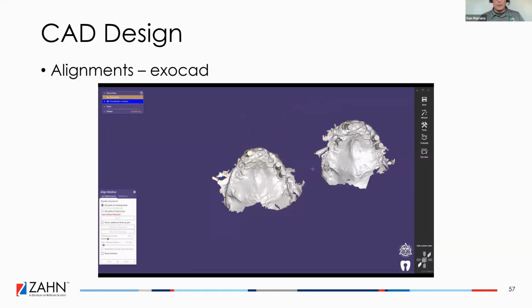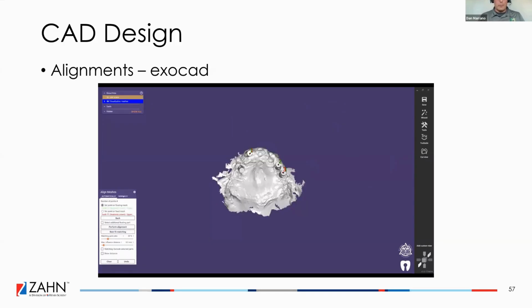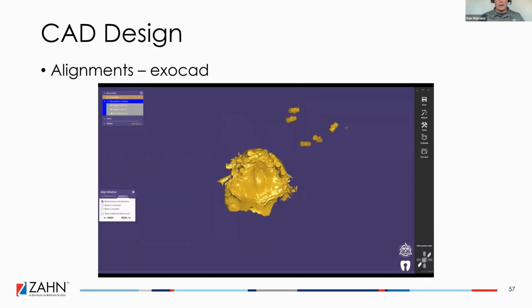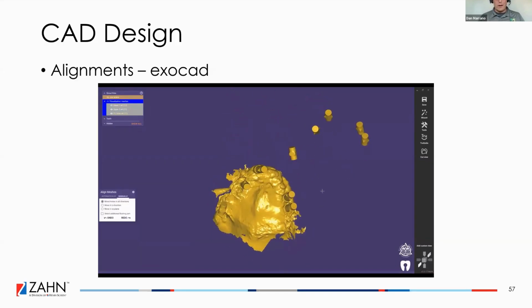Now here's his second surgical scan. Now we're using those desk scan bodies as alignments instead of some other ways that we can show you. But that's kind of the breadcrumbs that are being left for us to put the pieces back together to keep the orientation of our pre-design, so we don't have to redesign this case.